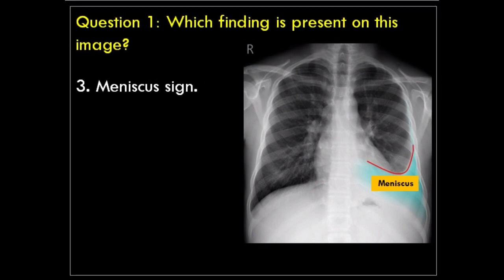The correct answer is meniscus sign. This is the classic meniscus sign of a pleural effusion.